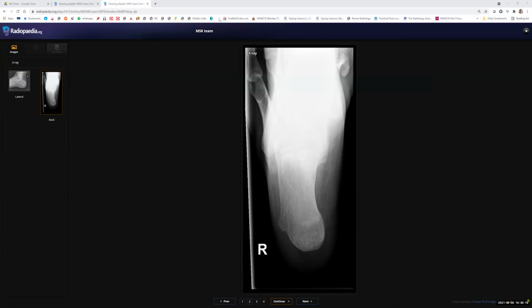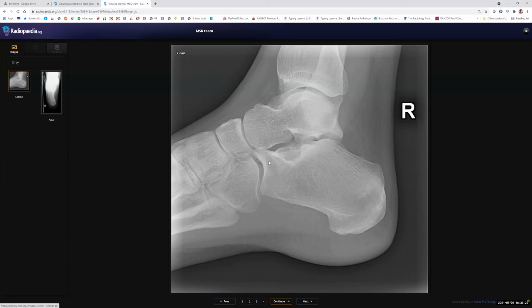That's all I can see in this. With heel pain, where is the periosteal reaction? Which area? Here, the calcaneum, up above on the upper end. No other findings? Perhaps enthesitis, with the attachment of the tendon. Probably. So what will you do?